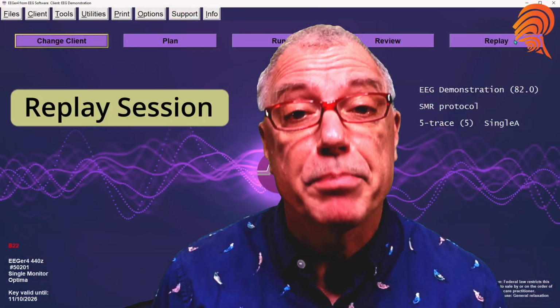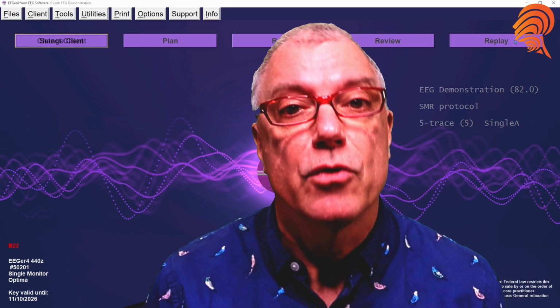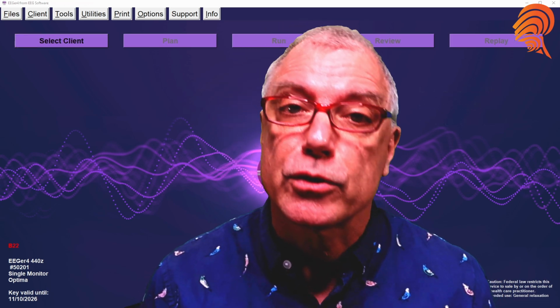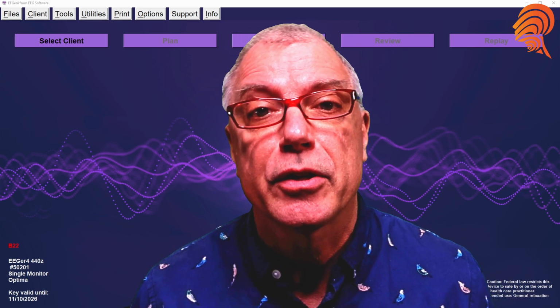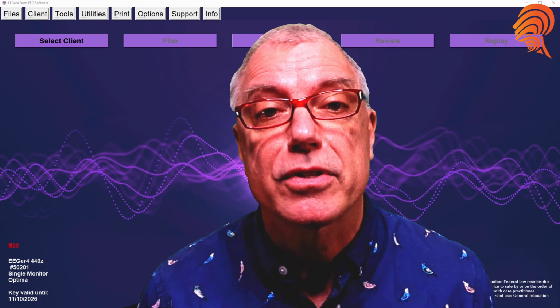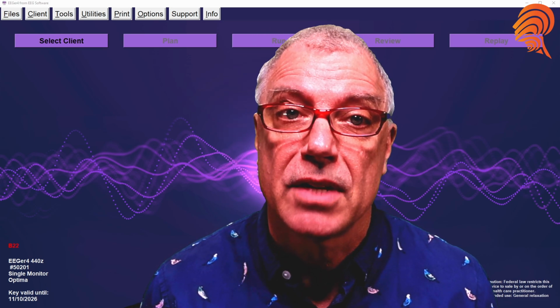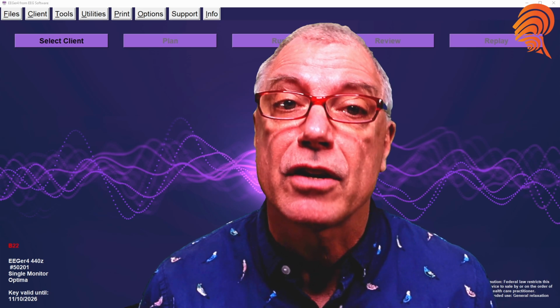I'm Lars from EEGer, and today we're talking about the replay session feature in the EEGer Neurofeedback software. Replay is one of EEGer's most powerful tools for clinicians. We're starting with this one because if you're unfamiliar with EEGer, it is the fastest way for you to get a glimpse into why people are so passionate about this software. I'll describe downloading and installing EEGer for free in another video soon.